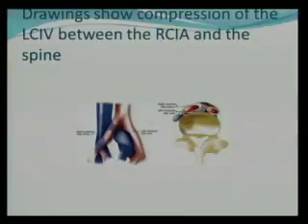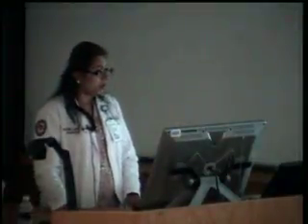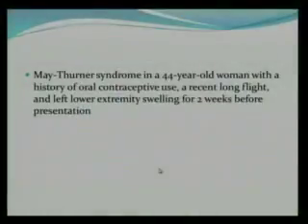Thank you. All right, any questions about the May-Thurner syndrome? All of you know what is compressing what? Carson, you? Yes. Robbie? Absolutely. Aaron? Yes, ma'am. Okay. So May-Thurner syndrome in a 44-year-old lady with a history of oral contraceptive use, number one whammy, recent long flight, double whammy, and left lower extremity swelling for 2 weeks before presentation.